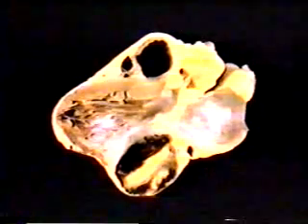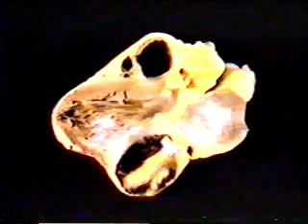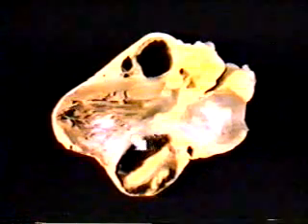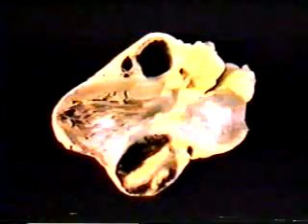This patient suffered an inferior infarct, and this is the resultant infrabasal aneurysm filled with thrombus. This patient had prior apical and inferior infarcts. The inferior infarct has resulted in formation of an infrabasal aneurysm. The neck of this aneurysm is also wide, extending from the mitral annulus, here at the base of the posterior mitral leaflet, to the base of the posteromedial papillary muscle.